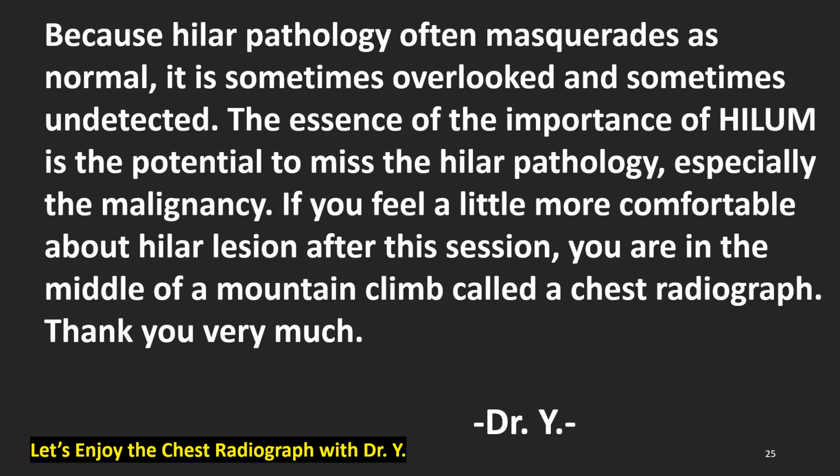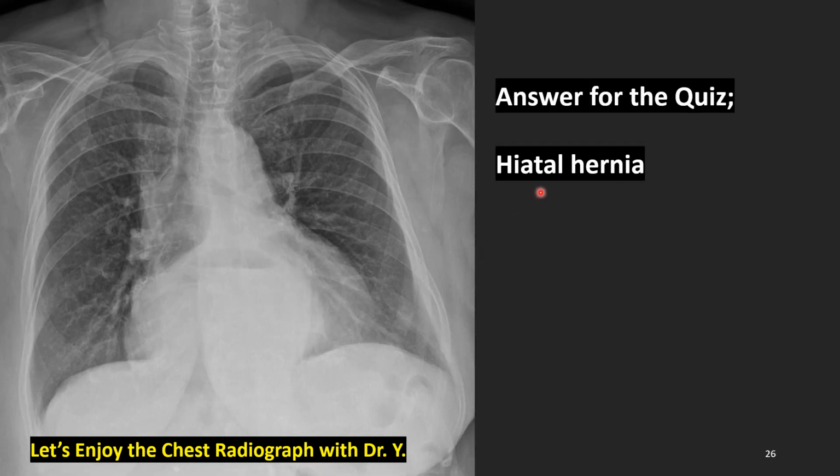Thank you very much. This is the answer for the last quiz. Are you correct? This is the stomach with an air-fluid level and food. There is no stomach visualized here.